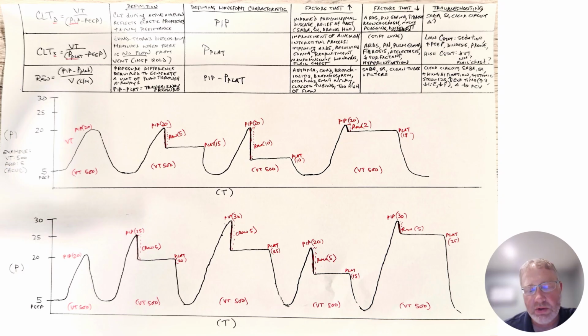So what that tells you is you can assume that in the case of this trend, the actual lung compliance got worse, but it is not a resistance issue because the resistance actually improved, right? So always equate your PIP with your dynamic, your plat with your static. Let's move down to the bottom row. Same deal. Pressure over time, tidal volume 500.